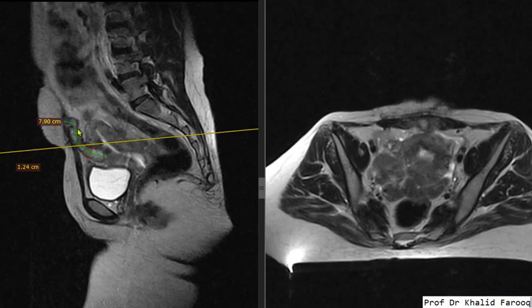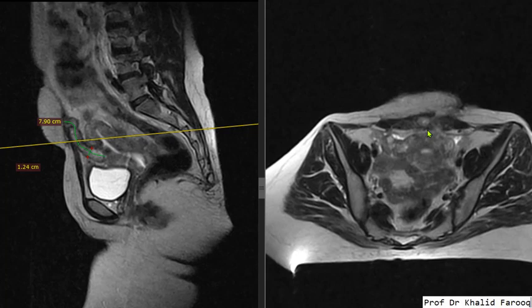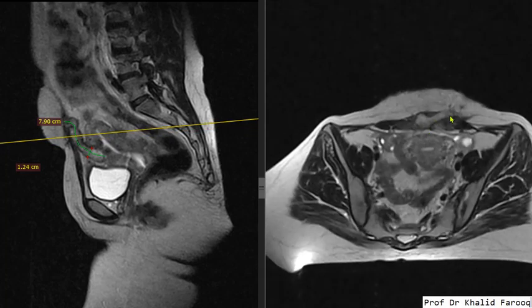it extends into anterior abdominal wall, from where it disrupts through linea alba between rectus sheath on either side. Here we can see it extends through rectus sheath at the level of linea alba into anterior abdominal wall on left side.